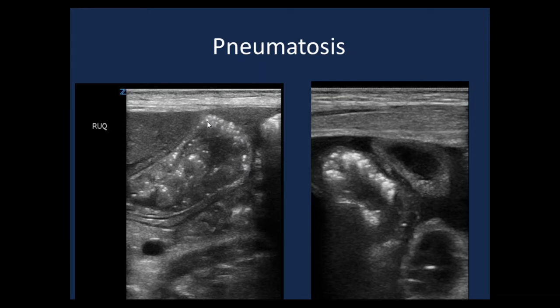And in our body, any fluid-air interface appears echogenic. So these foci are composed of air surrounded by the fluid content of the wall. That's why it appears echogenic.